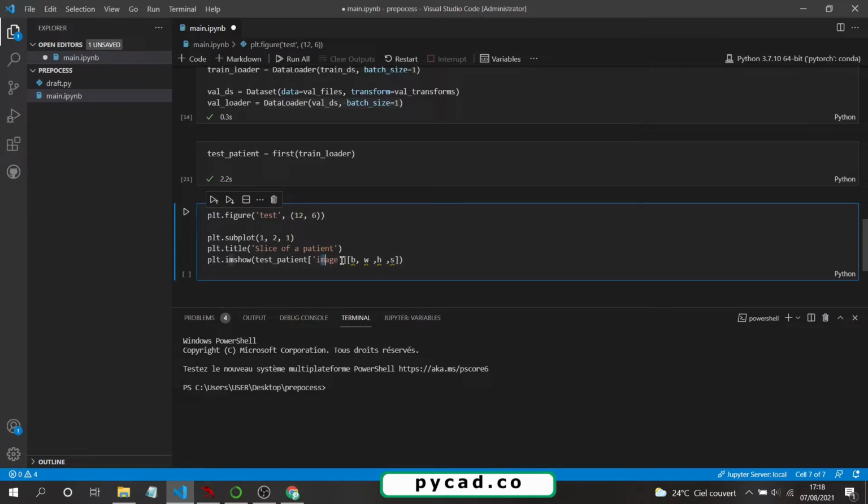Why am I talking about this? But actually, you are right. We need another dimension to define the foreground or the background, but we don't need it in the image. We need it in the label, and we will get it in the prediction label, but we don't need it in the image. But because we are doing some mathematical operations, we need to have the same dimensions for all the arrays or for all the tensors.